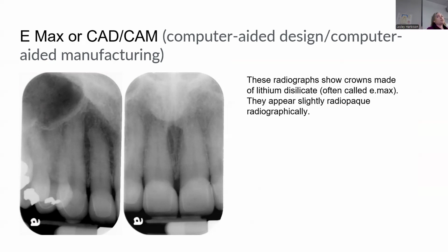So the dentist might use different materials, but you can see where the tooth has been prepped. These are probably more veneers or a very minimal prep on the tooth. And then you can see the material outline. So you can see the prep portion, and then the rest is like a porcelain crown.